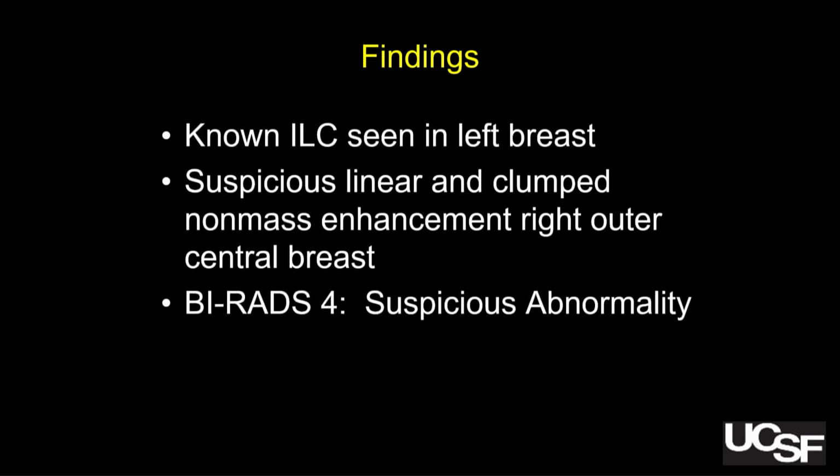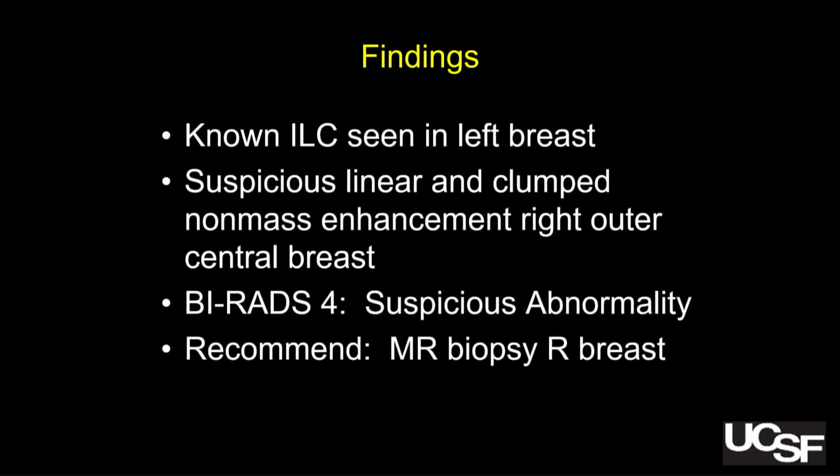At least that's what I thought. I called it BI-RADS 4 suspicious and recommended MR biopsy. Usually when it's really thin linear non-mass enhancement, I don't do breast ultrasound. I don't do targeted ultrasound, especially in a really large breast. This patient was pretty big. My concern is that I will be all over the place and I won't actually find the correlate.